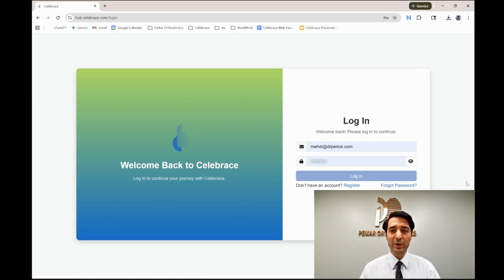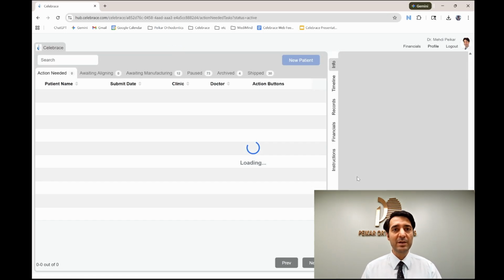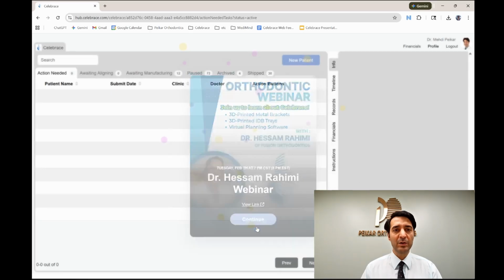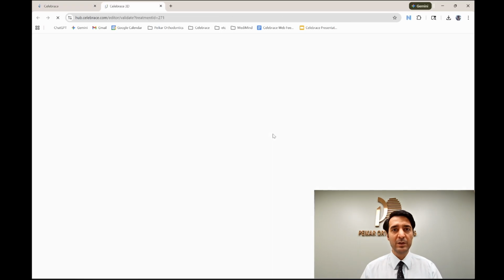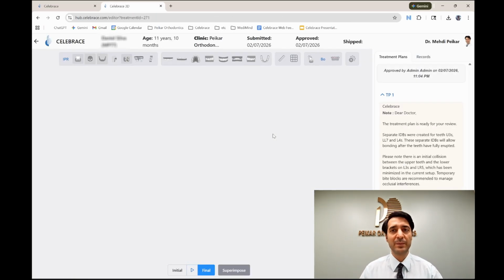Today, I want to show you a case in Celebrace software. I'm going to log in to Celebrace software, and I want to show you this case. I'm going to open the treatment plan for this Celebrace patient.